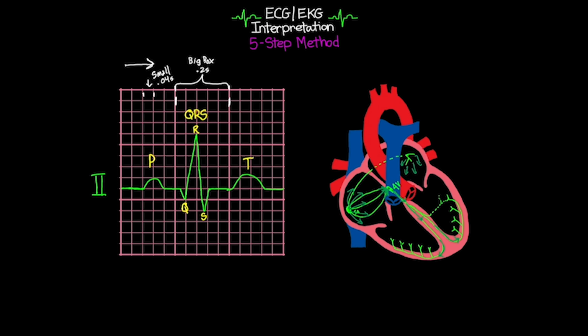You might look back at our rhythm here and think, oh, I don't remember them talking about atrial repolarization. And in fact, you'd be right, because we didn't. The reason for that is the atria do repolarize after a depolarization and contraction. But the problem is that the atria are repolarizing at the time the ventricle is depolarizing. As you can see, when we look at the ventricular repolarization, that T wave is significantly smaller than our QRS complex.